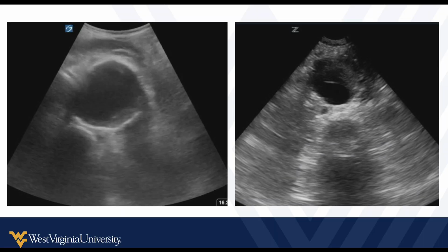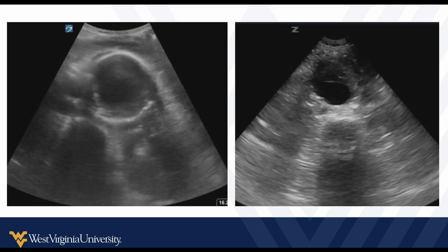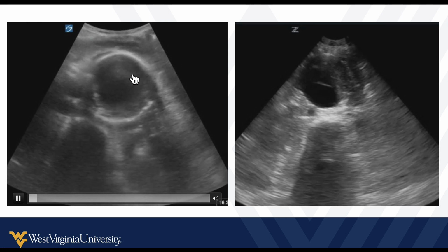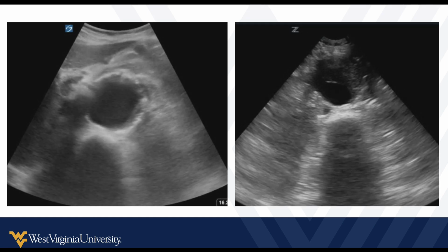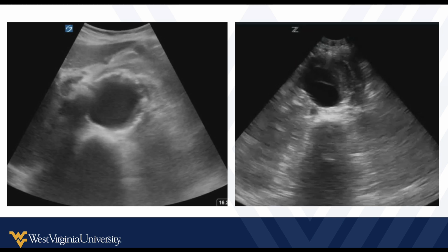Just some more examples so you can see what they look like. Again, when these are there, they're relatively straightforward and obvious to see. So here we see the vertebral body, aorta sitting on top, and it's obviously enlarged. Don't need to measure it to recognize its presence, but then we want to measure from outer wall to see exactly how big that is. That one, just eyeballing it, looks like it's probably 7 centimeters or so.